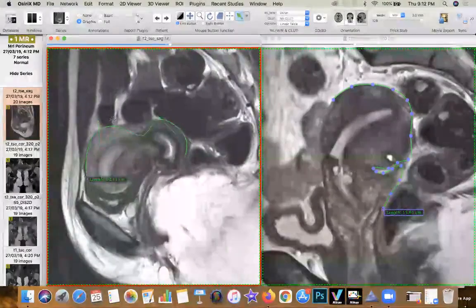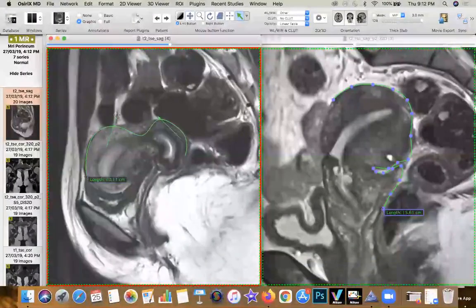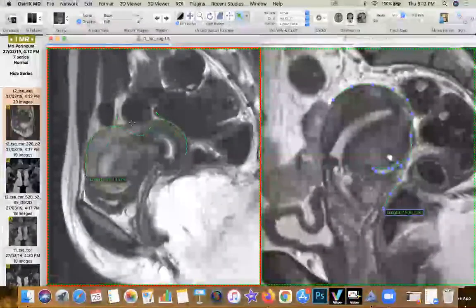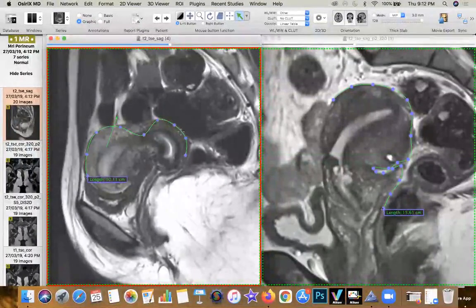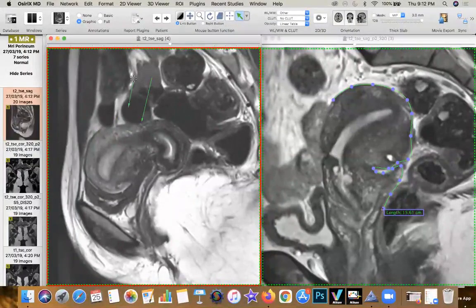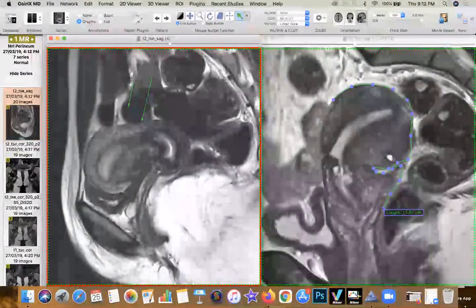So when you have this kind of a movement or this kind of a tug along the posterior surface of the uterus and the corpus, the first thing you got to realize is that there's something along the surface of the uterus, or there is something else which is tethered to the uterus, which is causing this contraction and reducing the space between the structures.